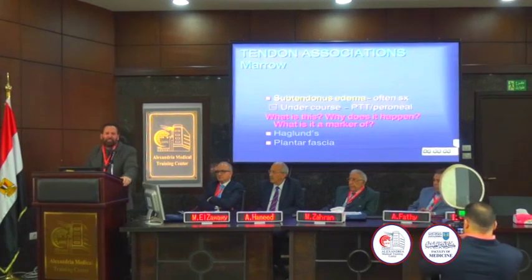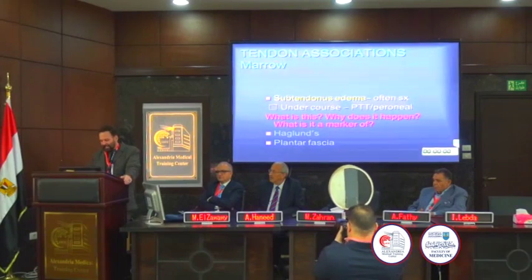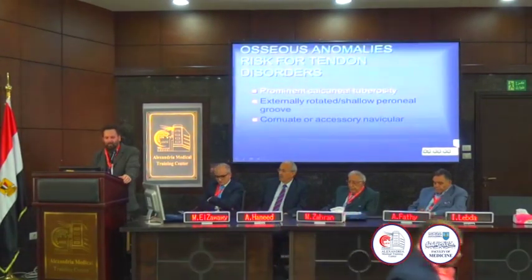Now, marrow associations. We showed you an example of this already today as well as yesterday. This was the case we showed you. You get reactive changes underneath certain tendons, and that finding is often a manifestation of pain. So can you see pain, doctor? This is one way that you can see pain with a tendon disorder.